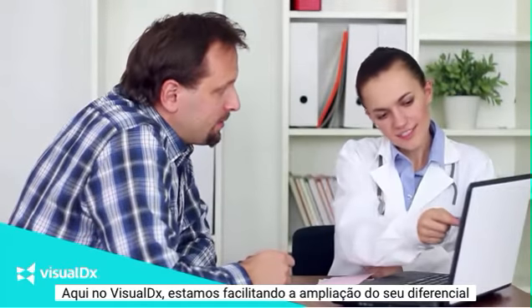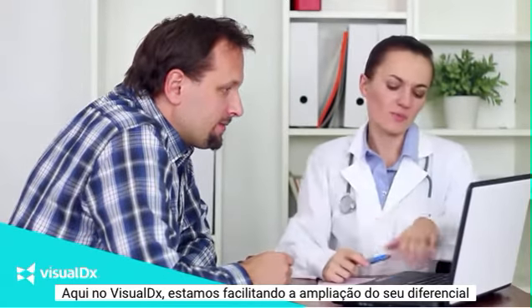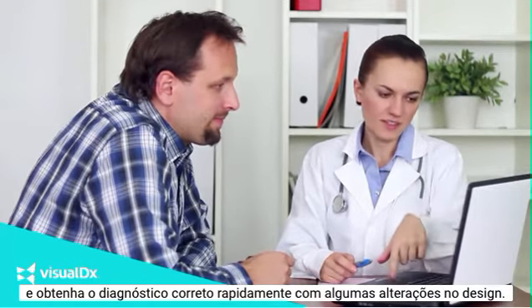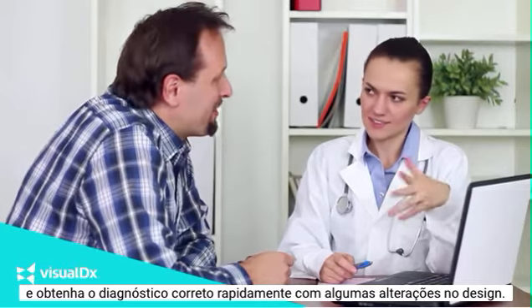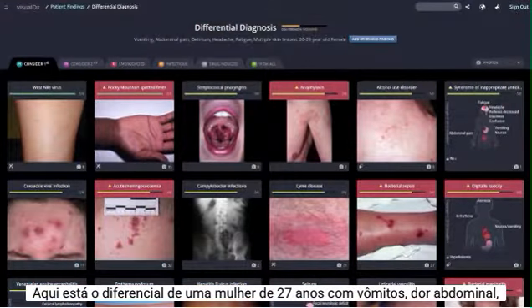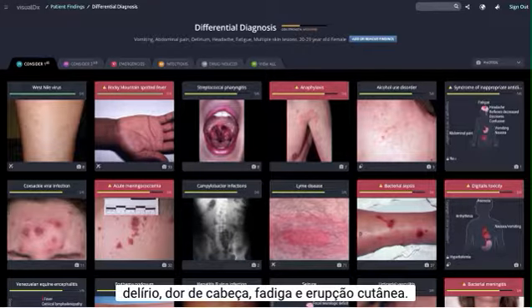Here at VisualDx, we're making it easier for you to both broaden your differential and get to the correct diagnosis quickly with a couple design changes. Here's the differential of a 27-year-old female with vomiting, abdominal pain, delirium, headache, fatigue, and a rash.